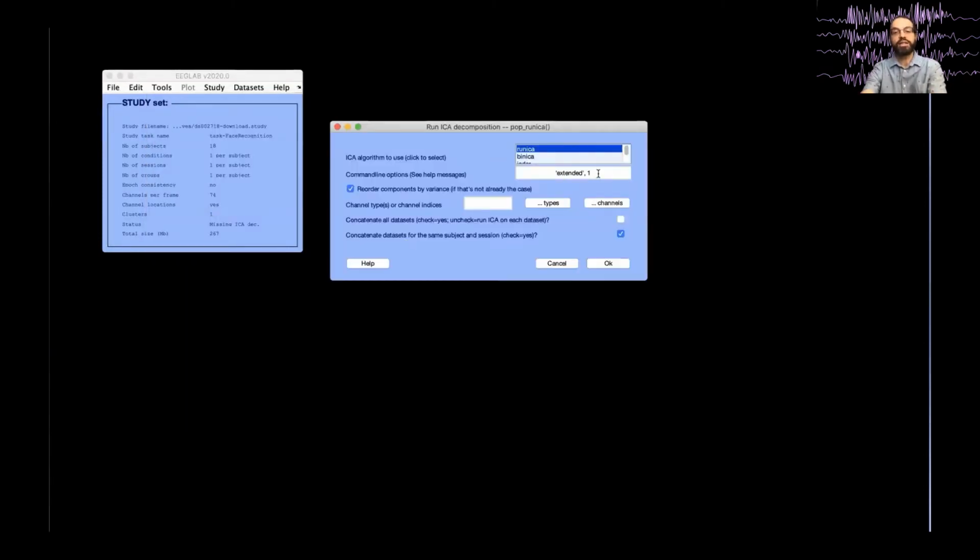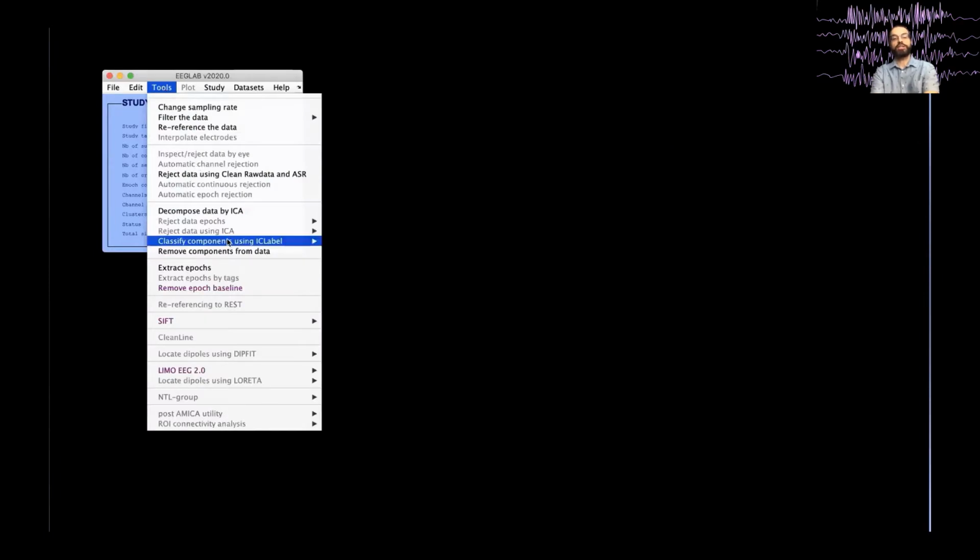Here I'm just selecting the default ICA. I have the option here to select PCA, so to reduce the data dimensionality by PCA, which is not usually recommended, but here we have removed one dimension when we did average reference, so we have to do that. Here I use PCA -1, which just tells ICA, okay, find as many components as the number of channels -1. And the reason I put PCA -1, here I have many data sets, so it's going to run ICA sequentially on every single data set. And so here again, I press OK, it's 10 minutes, then instantaneously.